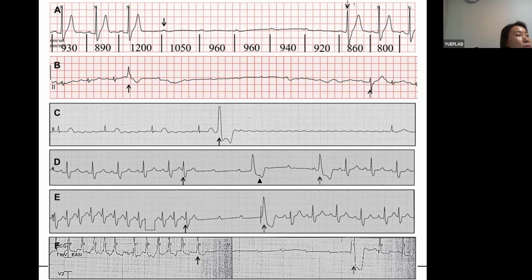Is it possible that your extrasystole conceals the sinus, originated from the right bundle and prematurely makes a left bundle pattern? So you may have a transient gap time with the recovered left bundle because you already have premature depolarization. They basically block that left bundle as well as the AV node. That may cause heart block. But you can only measure that by transseptal conduction time and so on. So that would be the explanation.